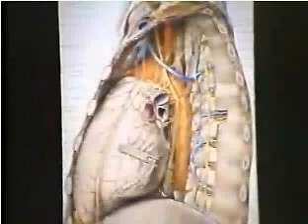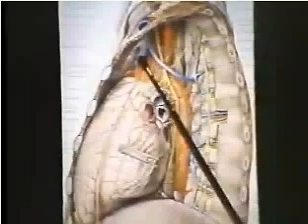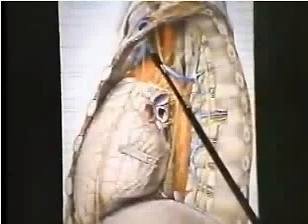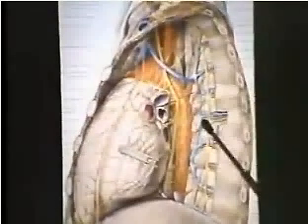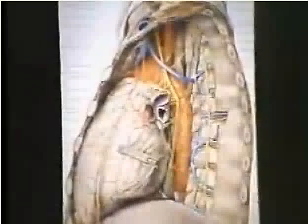What vein is this? This is a tributary of the left brachiocephalic vein here, where it is called the superior intercostal vein on the left. But back here, it's a continuation of the hemiazygous system, and therefore it's also called the accessory hemiazygous, and that is one and the same vein that's coming across here, and it's also known somewhat irreverently as the aortic tit because of its appearance on the chest film when it is over the aortic arch and when it is engorged, as it is in this patient with heart failure. So that is the vein which in our other patient sagged into the AP window and looked like a discrete mass. We now recognize that to be a normal variant.